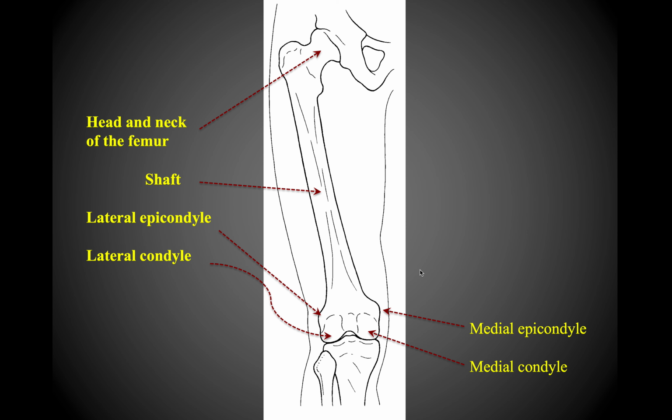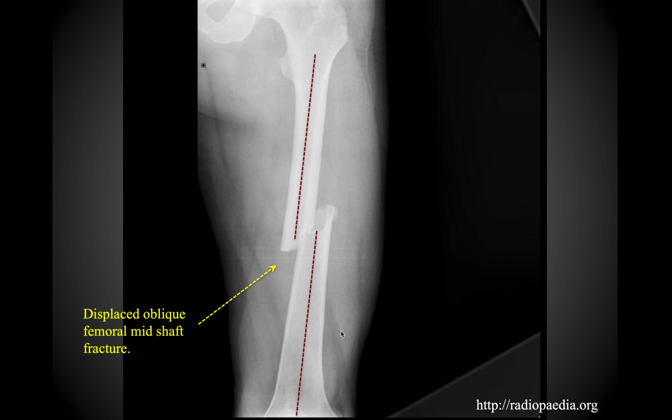So now looking at the more distal part of the femur, remember that we have a long shaft. The femur is the strongest bone in the body. It's also one of the longest, and so it does take a tremendous amount of force to fracture the hip, and the proximal part of the hip is the most at risk due to the angulation of it, but the shaft is also certainly at risk of fracture, and so we'll look at that here momentarily. Distally, remember that we have the medial and lateral epicondyles, and below that we have the medial and lateral condyles, which sit on top of the tibial plateau, and those are both going to be covered over by articular cartilage. So you also have potential osteoarthritic change that can occur along the medial and lateral condyles in older individuals.